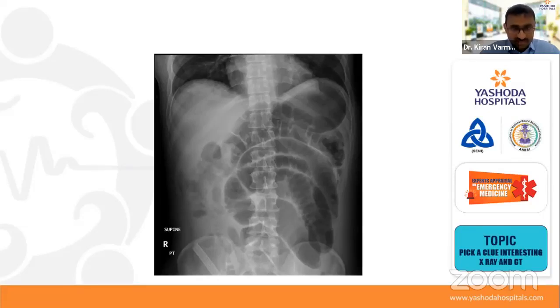Intestinal obstruction. Exactly, this is intestinal obstruction. So is it large bowel obstruction or small bowel obstruction? Large bowel or small bowel? No, that is not coffee bean. So people are telling us the large, Mainika, Ayesha, Usha, small. So first of all, you should know how to differentiate between small bowel obstruction and large bowel obstruction, especially in X-ray findings.